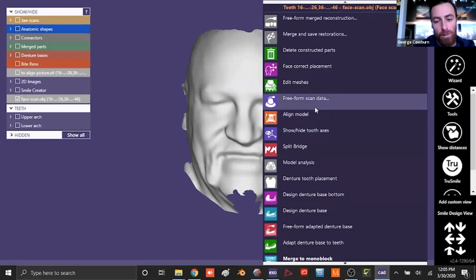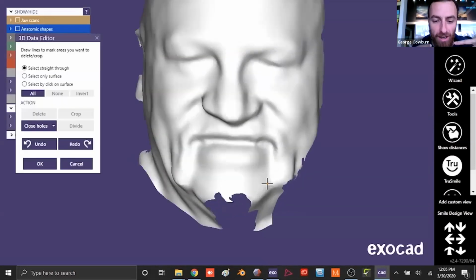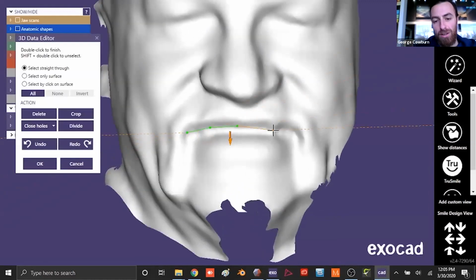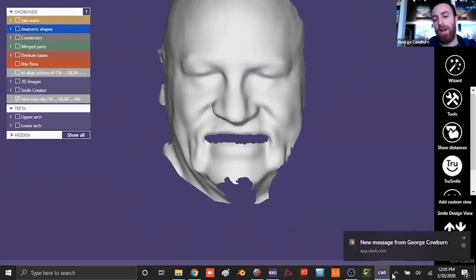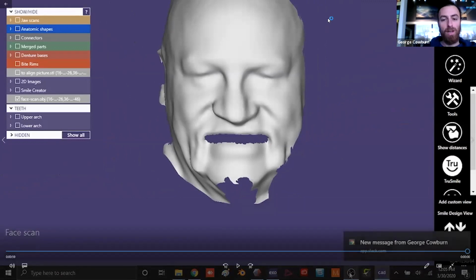So when you saw me aligning the picture, we were only aligning the picture from the anterior teeth. When you have a full bite fork, what you're actually doing is you're aligning exactly where the plane of occlusion is compared to the outside of the face. So the information that we're getting from a 3D data set is much more accurate, especially with the DOF face snap, than it would be, for example, if we're just trying to align a 2D picture.